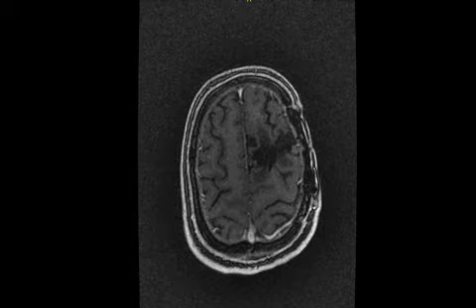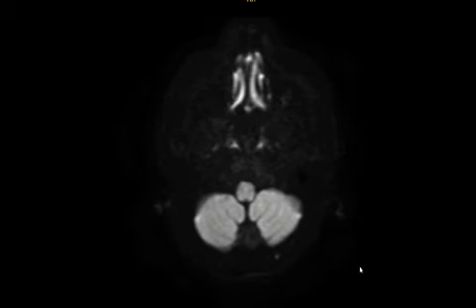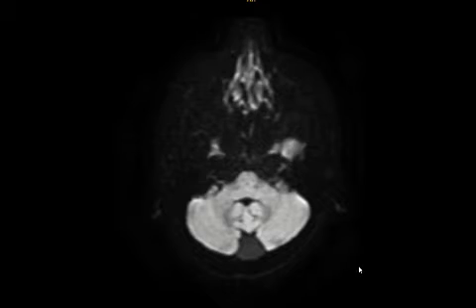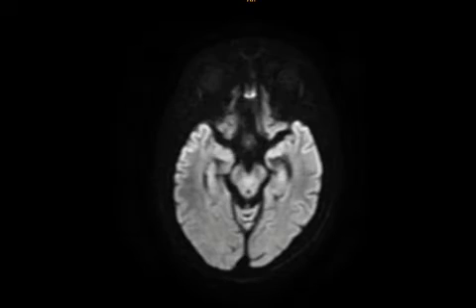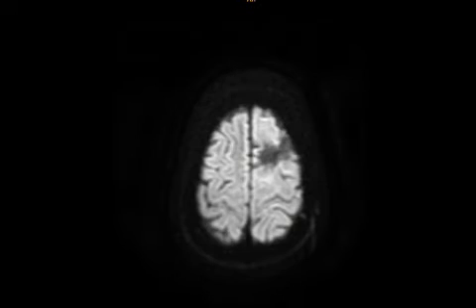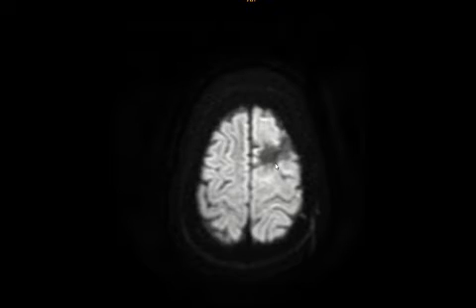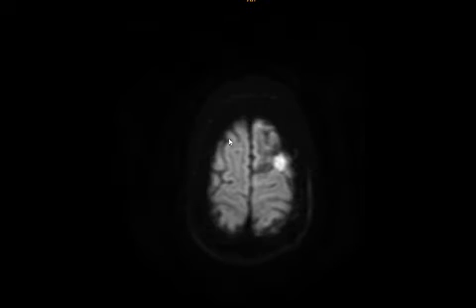Now let me show you the MRI which was done today, on December 12, 2020. I just showed you the MRI from one year back, and now these are diffusion MRI images. You can see the cavity here, and you are thinking, okay, this looks normal, but boom, you can see there is a lesion here, and it's showing apparently restriction of diffusion.